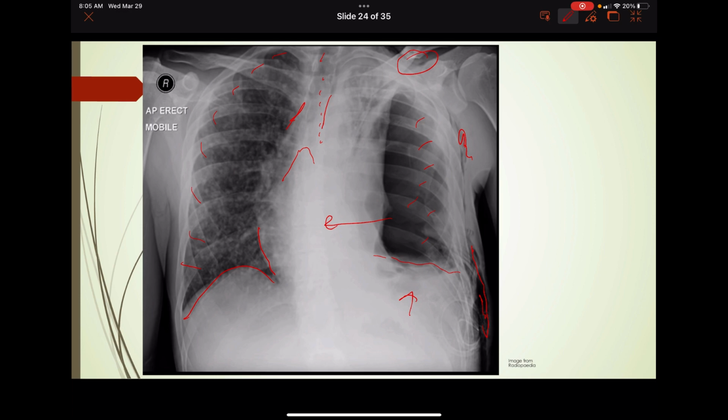They probably should have picked this up before this chest x-ray, but I would imagine he's starting to show signs clinically. But he obviously needs a finger thoracostomy and a chest tube, or a needle thoracostomy if you don't do chest tubes. And interesting x-ray though.